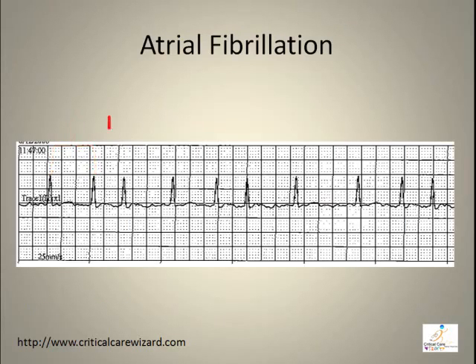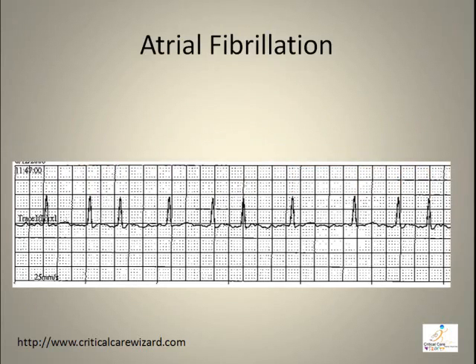Atrial fibrillation features a rhythm that is irregularly irregular. Atrial fibrillation classic appearance is an indiscernible P wave.